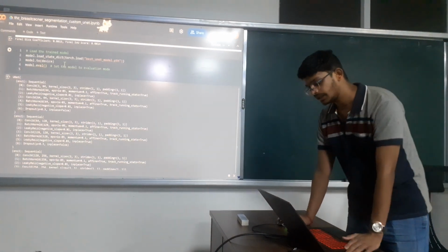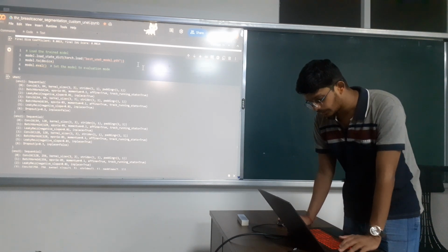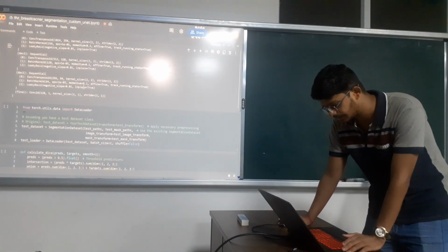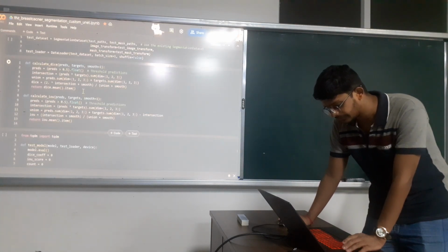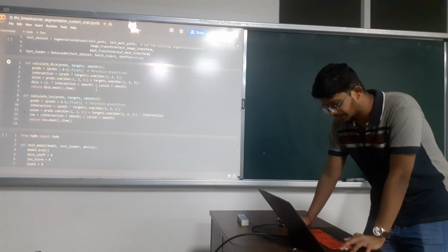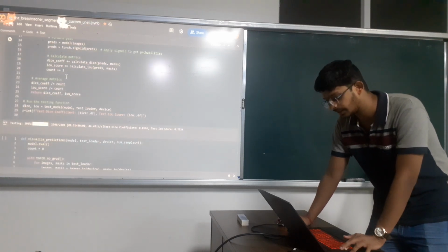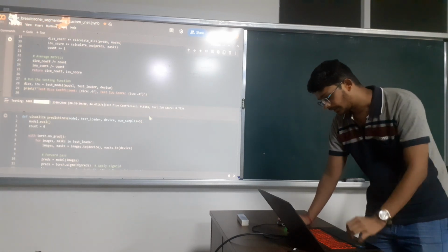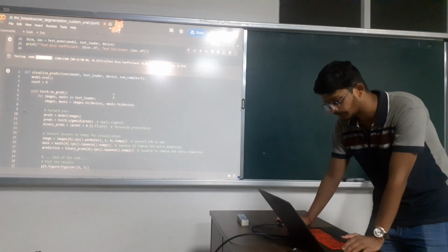And in that way, I have stored the trained model inside my Google Drive in the Colab notebook, with the model evaluation and model moved to device for the GPU. This is the whole architecture that I had used. So after the training evaluation is done, for testing the model on the data, I have created a testing loop. This is the no grad function with the forward pass, calculate metrics, average metrics, as I had used earlier. Same thing with 2300 images for the testing file, and the dice coefficient I received here is 0.8116 and the test IoU score is 0.7534 for the best model.